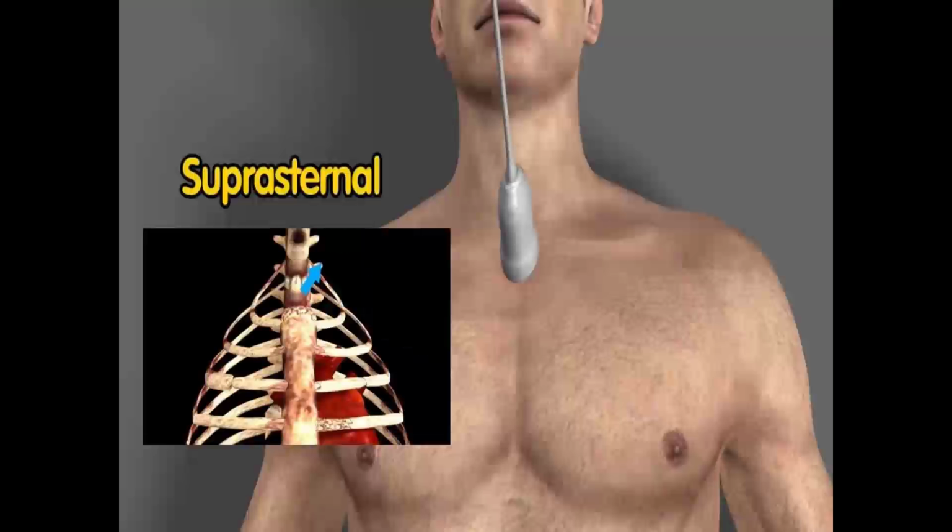And finally, we have the suprasternal cuts as well. It is usually used in the pediatric group, but in adults we still use these views if you're suspecting dissection of the aorta or coarctation of the aorta. If we are searching for atheroma in the aortic arch, it can be seen by transthoracic if we exhaust ourselves a bit. If you're having aortic stenosis, you have to finalize your study by searching for the gradient in the suprasternal approach. It might be even higher than the apical one. So we have to be sure how to make use of this suprasternal approach.